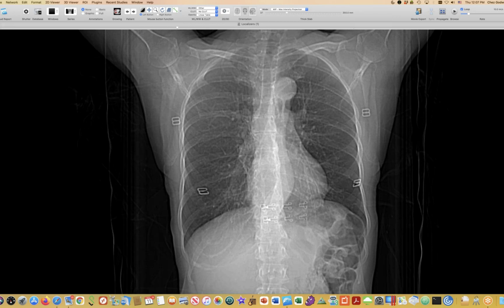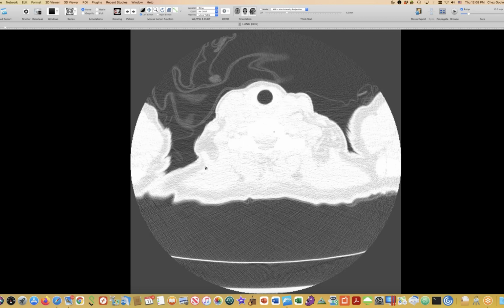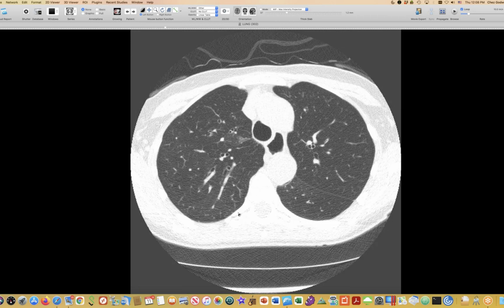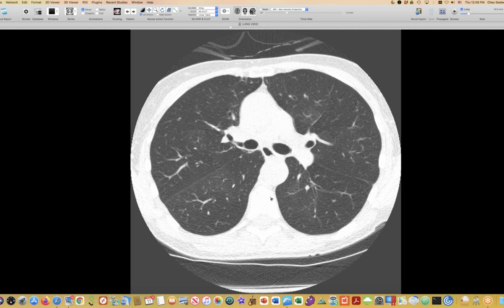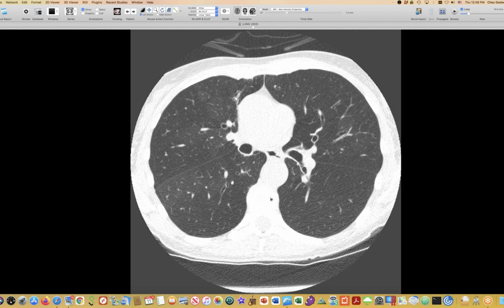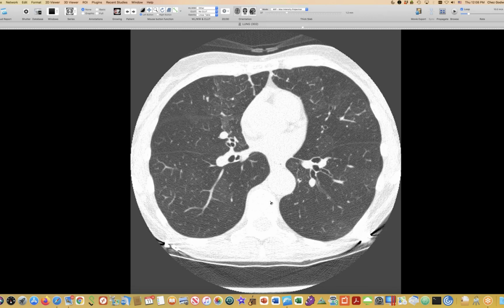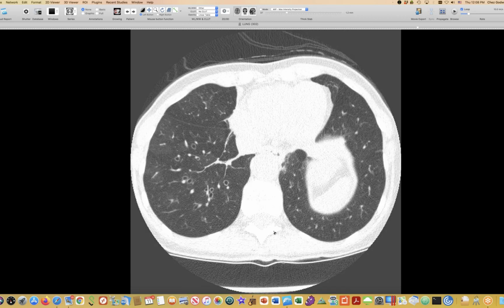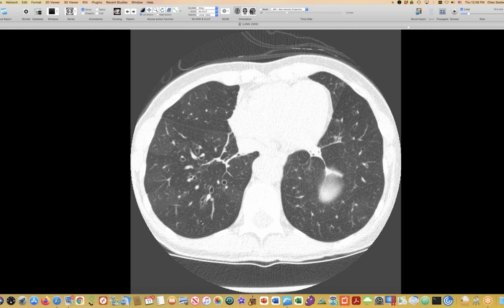And her previous imaging had been unremarkable. There was some mild bronchial wall thickening on an earlier CT. And shortly after her diaphragm fluoro, she went for our own CT. And it does show that she's got this generalized bronchial wall thickening and mild bronchiectasis pretty much everywhere through the lungs. And this is the first study of this quality that she's had.